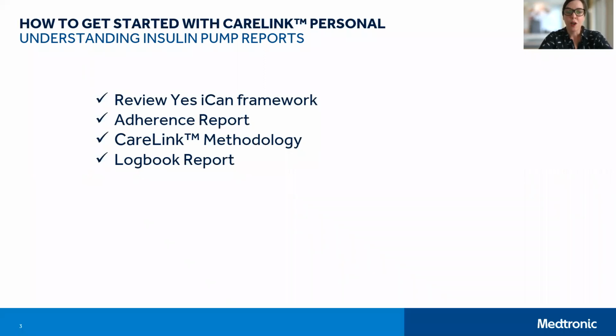In this video, I'm going to review with you how to apply the Yes I Can framework that we discussed in the first video in the series. We're going to look at the Adherence and Logbook report, and I will orient you to those and also show you how to apply the CareLink three-step methodology, which is just a methodology that all of us healthcare professionals use to approach your reports. We're going to give you the inside scoop so that you can do that yourself as well.